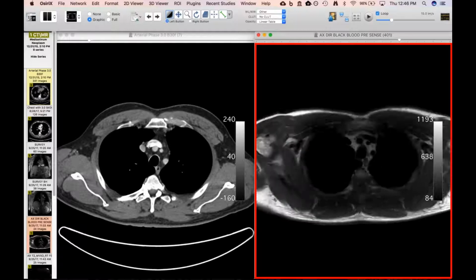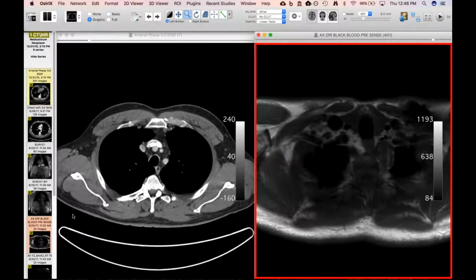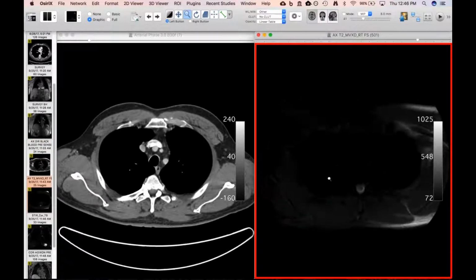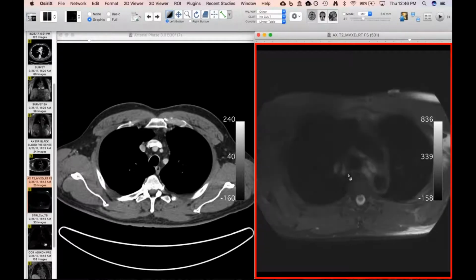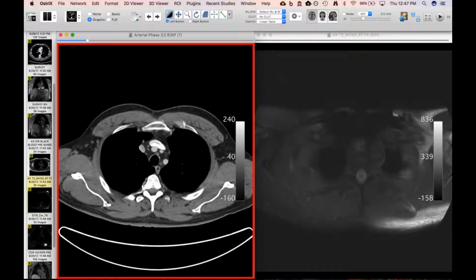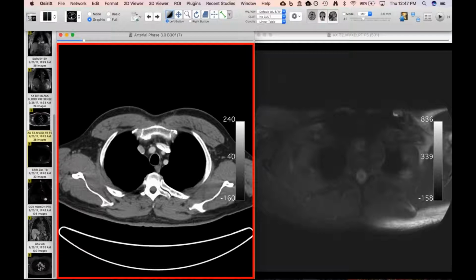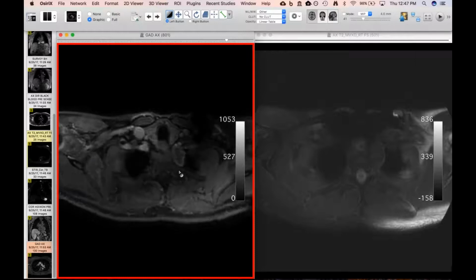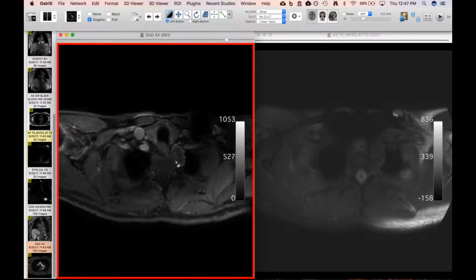They went to try to further characterize it with MR, to see if it was a nerve sheath tumor, which didn't really help that much. It certainly wasn't a cystic schwannoma or anything. It was not that bright on the T2 images that you see here, and it enhanced. I don't think this added anything to the differential, because it needed to be biopsied or taken out anyway. But it did turn out to be a slow-growing renal cell carcinoma metastasis rather than a nerve sheath tumor.